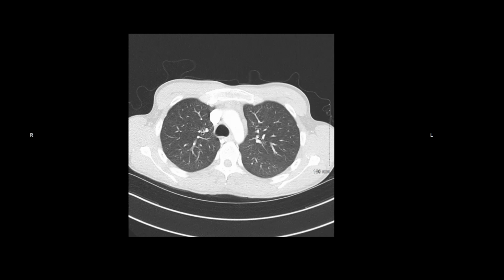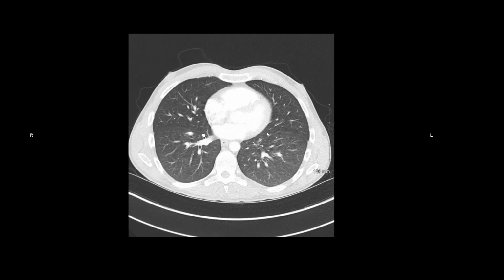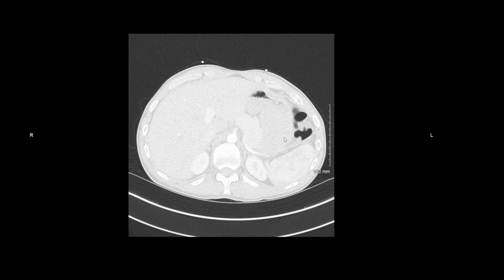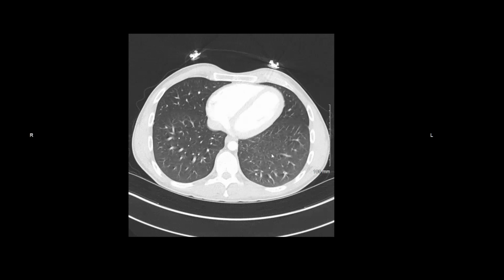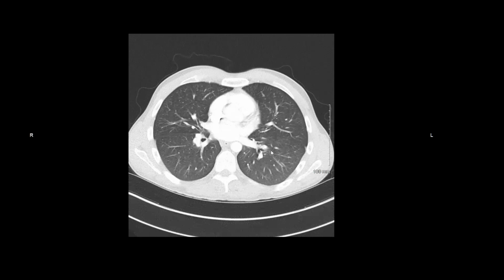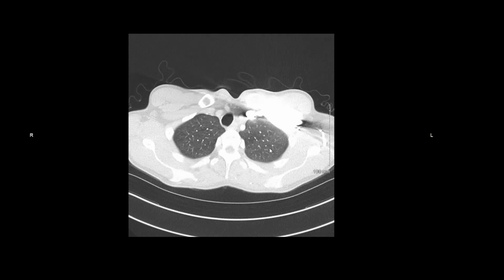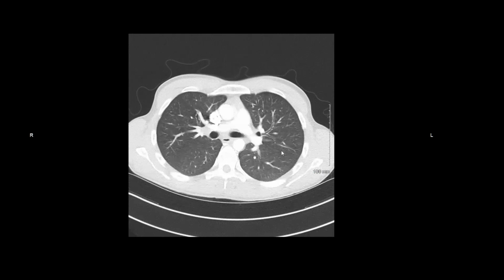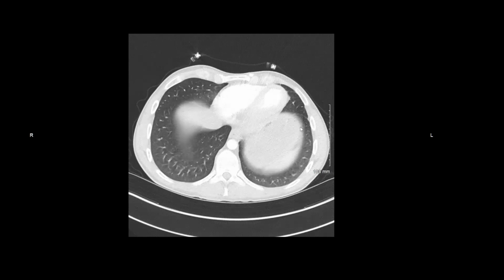As I proceed inferiorly, I will look at the anterior left lung for any nodules, any airspace disease, any septal thickening, any ground glass opacity. I'll follow that all the way down into the lingula. I'll then focus my attention on the posterior half of the left chest, coming back up, again, looking for any airspace opacification, nodules, septal line thickening, pleural scarring. Don't see any. I'll then follow along the fissure, looking for any fissural nodules or fluid or thickening or calcification.